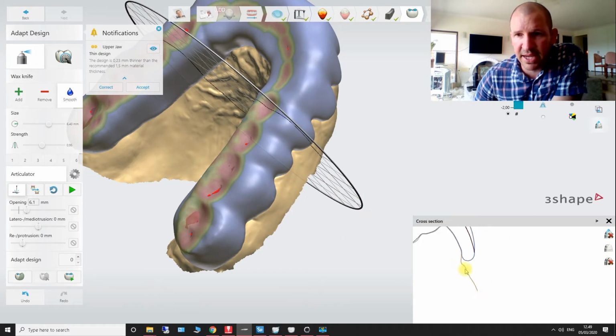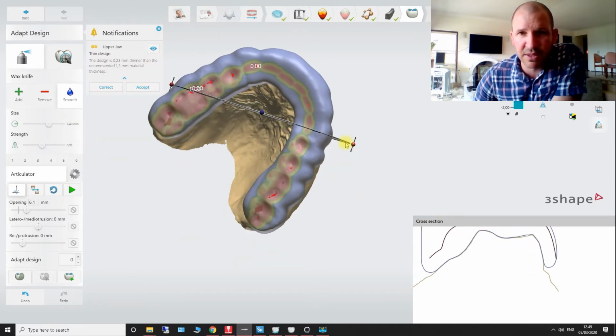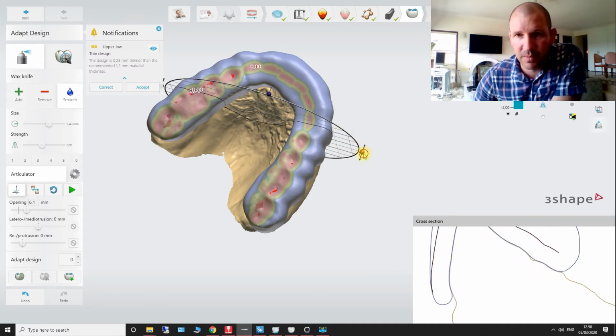So we're going to test our posteriors, so you can see we're just engaged in all those undercuts. And then I'm going to start to spin this around. So there's 3 at this point in time. Hold on, let's just go. Hold on, let's start on this side again.